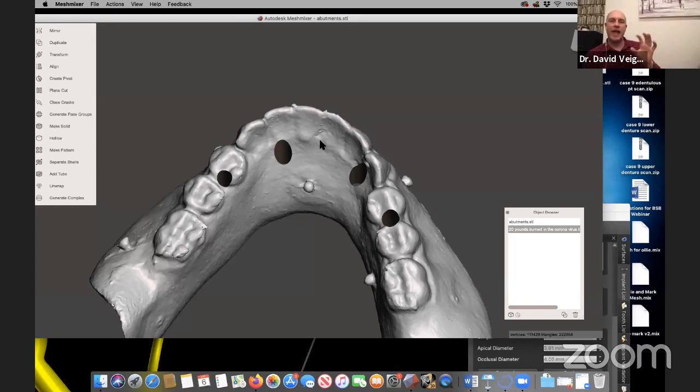If I don't scan it outside of the patient's mouth, all I'll have is radiographic markers inside the patient with no scan prosthesis that I can convert into a surgical guide. I'll have no surface to be able to create. So you need that dual scan to first orientate the prosthetic envelope to the patient, the soft tissue surface of that scan appliance to the patient, which then will be converted into the surgical guide.